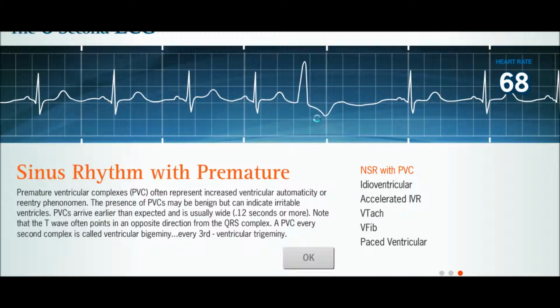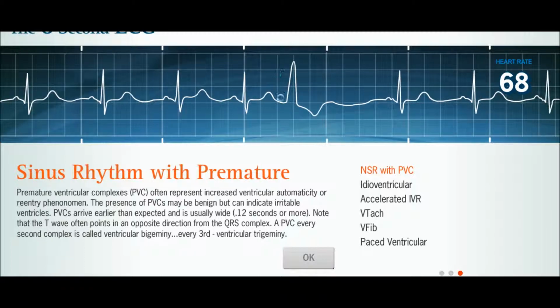ventricular contraction. These can be pathologic. You don't want to have a PVC because these things can turn into VFib very, very quickly if they happen at the right time, because you can get a reentry rhythm, or a reentry phenomenon, as people will call it also.